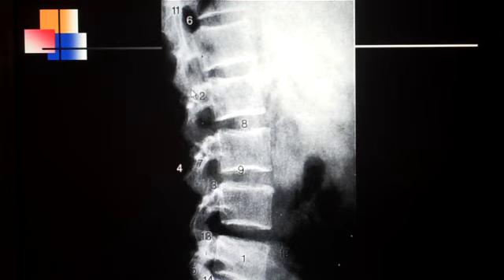If I go up to this segment, you see there is the apophyseal joint. Number 4 is on the spinous process. Now it's a little bit further back on this film, and so it really is on the spinous. Number 5 is on the inferior articular process of the last lumbar, and again, here is your apophyseal joint right there between 5 and 14. The sacrum does have a superior articular process, and that is number 14 on this film.